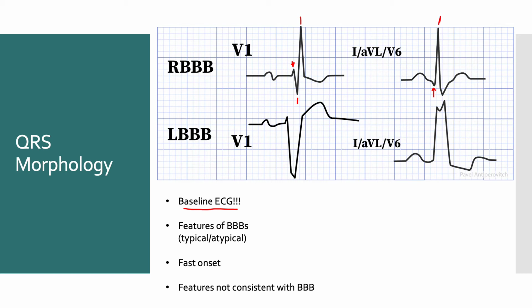It's got a nice narrow part of the QRS, and it's got this very slow, slurred, shallow S wave. The shallow S wave is the part that tells me that this is probably a right bundle branch block. This is the RV myocardium that's slowly activating dyssynchronously in a cell-to-cell fashion. And the reason why the first part of the QRS looks identical in every lead to a normal narrow QRS is what I'll describe in the next slide.